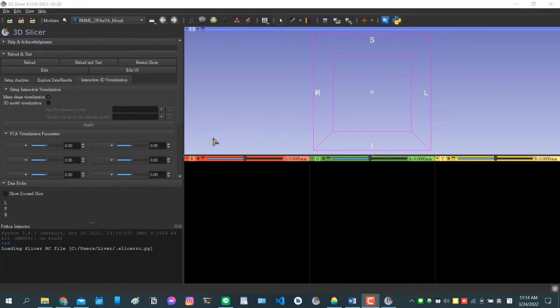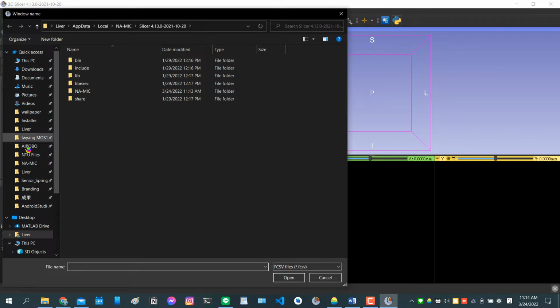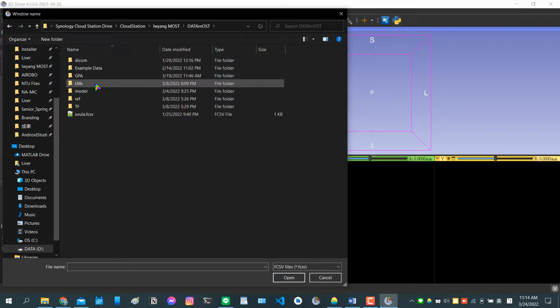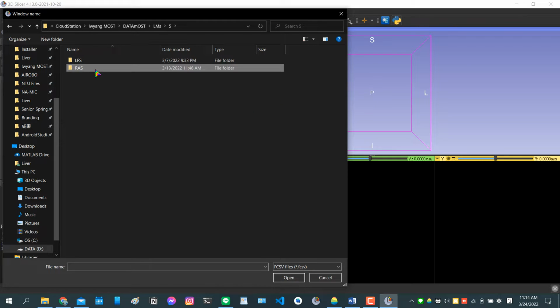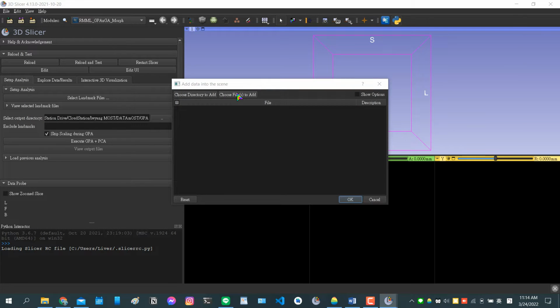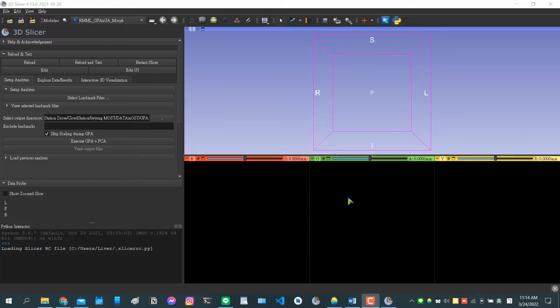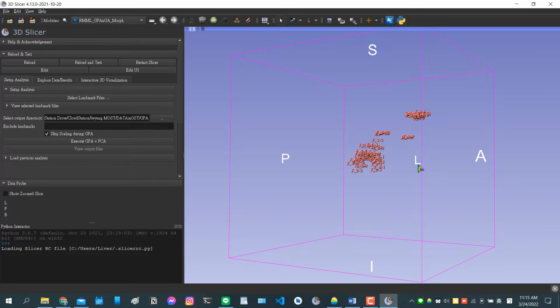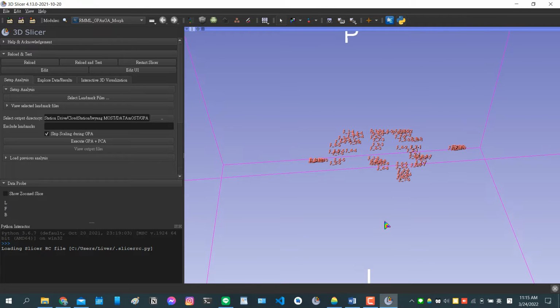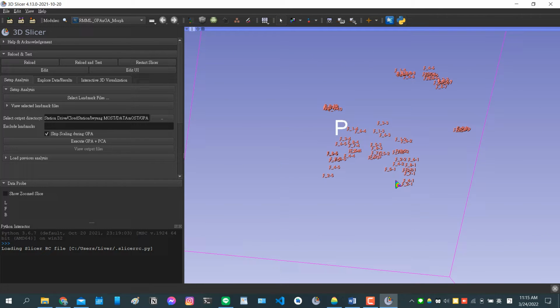In this video, I will show how to use my customized module to use GPA and GA morph. Okay, so first of all, you need to select the Landmark file we need here, and let's take a look at these Landmark files. Okay, so you can see this actually is the Landmark file we will put into the module.